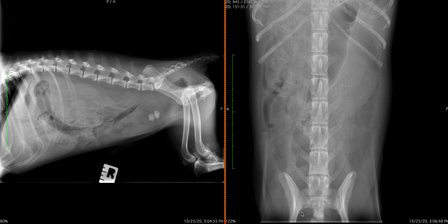Our conclusion for this patient is severe retroperitoneal effusion with mass effect. This means we have to consider the possibility of a mass, and potential tissues of origin can include the left kidney, again due to both ventral and possibly rightward deviation of the descending colon, the adrenal gland, the retroperitoneal space proper, or regional lymph nodes. More specific differentials can be explored for each.